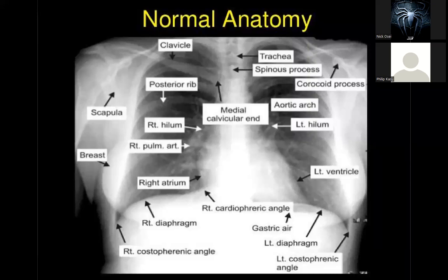Yeah, so this is where we ended off last time. And as I was saying, when you take a chest X-ray, you should be able to easily identify some of these structures that are listed in here. A few of them of note, the important ones here, for instance, the trachea. If you look at this X-ray, you can see that there's some translucency within all this opacification here.